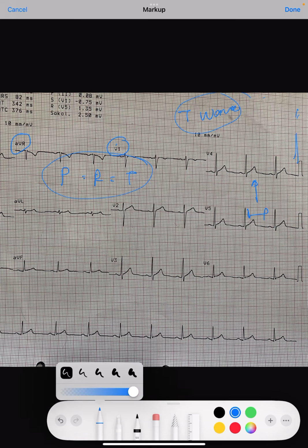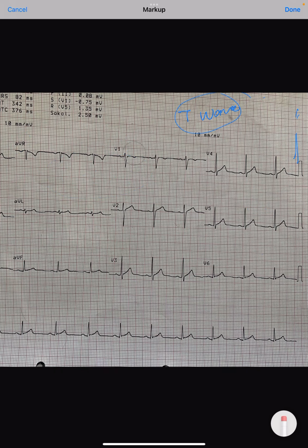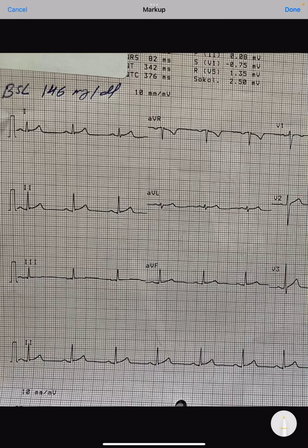If this T wave is negative, then we can consider that the patient may have ischemic changes, or the patient may have coronary artery disease, or new onset of T wave inversion or T wave negativity may also suggest the patient may have coronary artery disease.